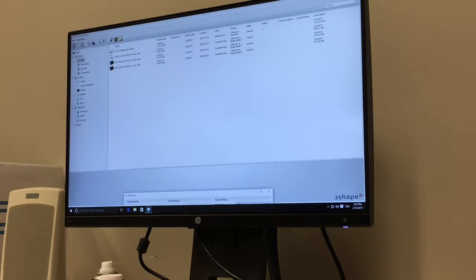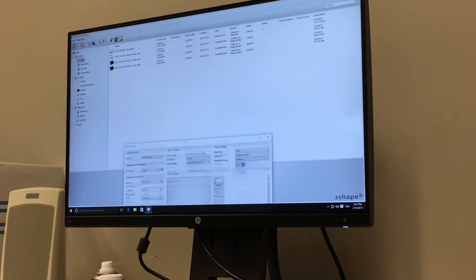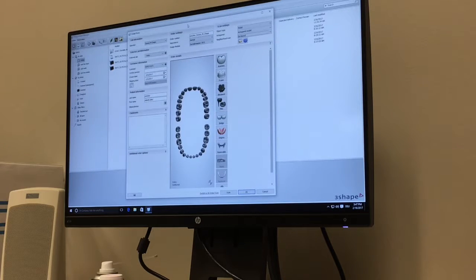So you start with opening your order, which we did already. I pulled it up. And put the operator's name, put customer number, which is ours, the number from the dongle for the program.